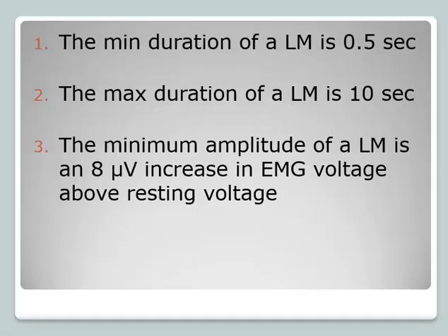As you probably have picked up, there aren't really voltage meters on our system. So the basic thing is you need to know that it's 8 microvolts because they'll question you and test you on the standards and the criteria. But the thing is, do you see a leg movement or do you not? Is it like a twitch, which would be less than half a second long? Then that doesn't count. Or is it overt body movement? Because that typically is longer than 10 seconds.